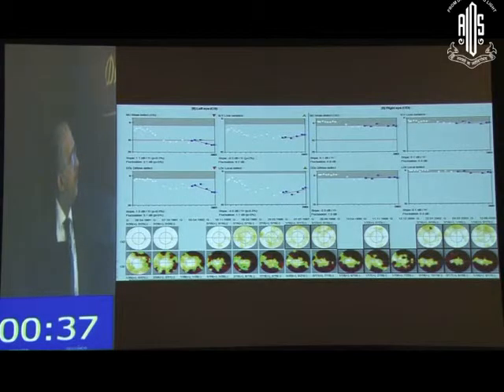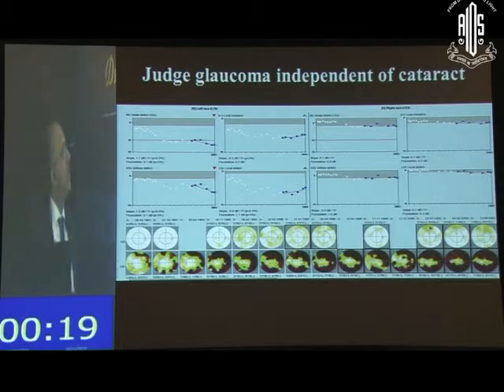Again, take a look at another example. The right eye is more or less stable, and the left eye is showing a change. There's a deepening of the scotoma in the upper quadrant and a new scotoma appearing in the lower quadrant. You can assess this change: the mean deviation is showing a deterioration, that is the hill of the island of vision, while the square root of loss variance remains the same. The local defect remains constant, and it's the diffuse defect, that is the changes from the cataract, which are getting superadded and causing the deterioration here.